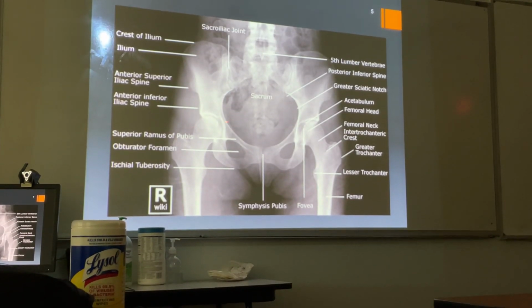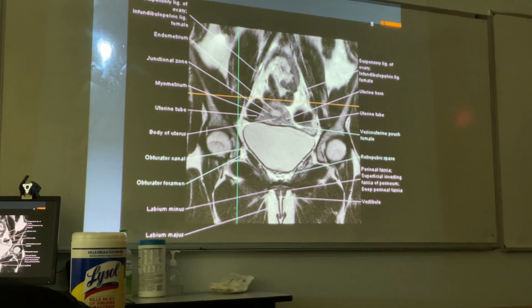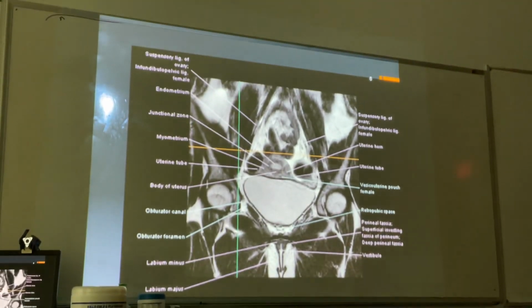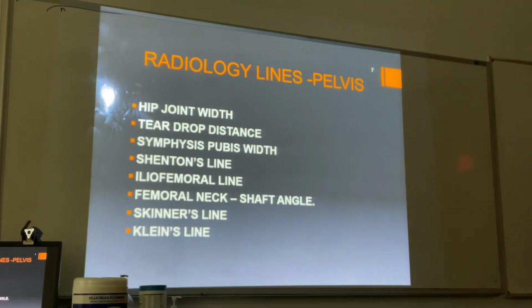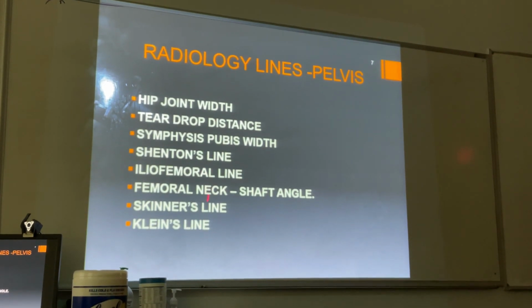What we're focusing on is the hip joints, to whatever degree you want to enter into that. At this stage, we're just saying this is still femoral head, a full bladder, coronal perspective. We'll expand on it. We're going to spend a whole lot of time talking about this. If we didn't cover it before, we are now talking about it. If we did, it's a good review because there are certain lines that apply to the hip joint.